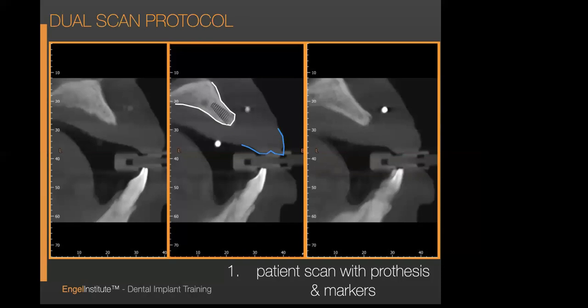Now I can very accurately position my implant to be in the long axis of the tooth or the cingulum. And this is fantastic because in 95+% of my cases, nothing comes through the facial. Even more, probably 98%. On my implant overdentures, they all land in the deepest part of the vestibule, so I don't have any show-throughs of abutments. And you can plan it simply by this.